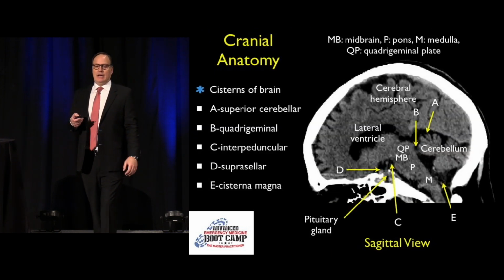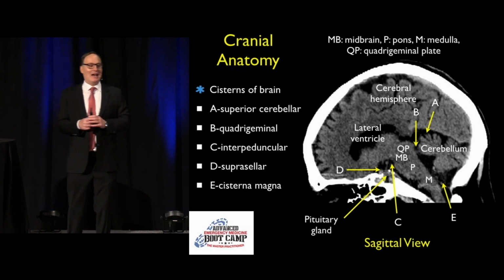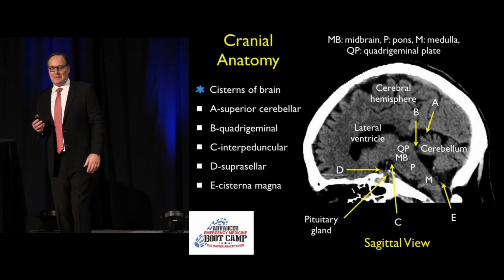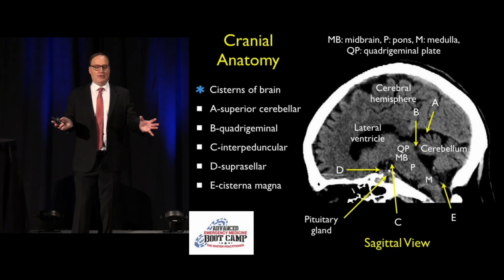Cranial anatomy. Okay, so this one, this is the one I like to joke, there'll be a small examination afterwards. I can usually get my residents every time on this. But I think the takeaway point is that we have a global understanding of the brain.